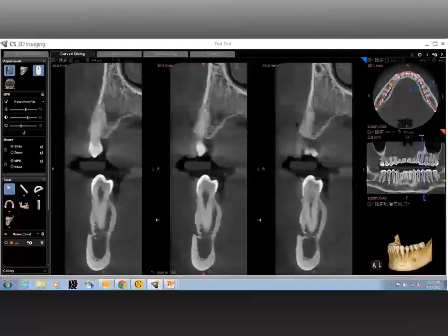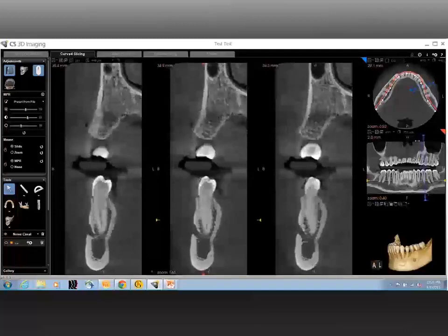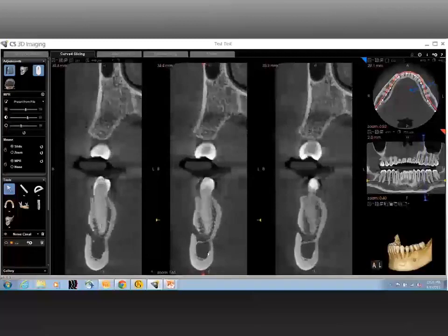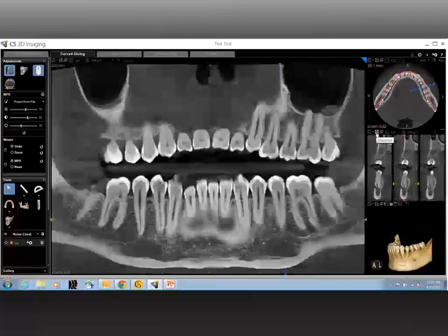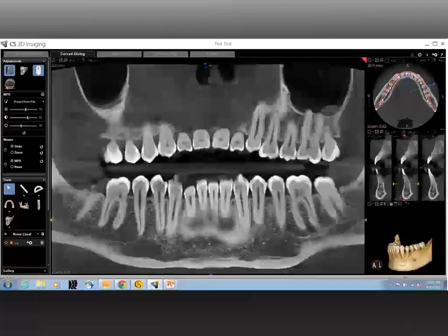So the mental foramen, one of the key structures to be noted around the premolar area, is very prominently visible. Just like as you see over there, you'd see a clear separation from the inferior and the superior aspect. Excellent. I think that should explain that. You mentioned the lingual foramen. If you would, I believe we'd find the lingual foramen right in the midline in the mandible. If you could show us that also.